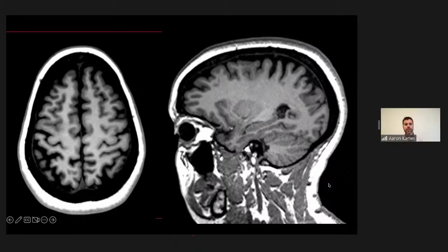It's still a challenge. And I would say the patient is having some hand motor seizures. So I'm going to clue you into where the abnormality is, and holy cow, this was a case that was missed on multiple reads. So you should absolutely not feel like this is an easy-to-detect abnormality. Here is where we thought the seizures were ultimately coming from.